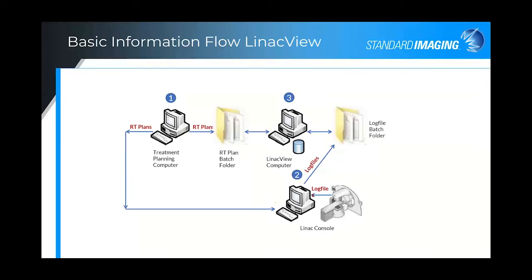So here's the basic information flow for LinacView. You start with the treatment planning computer and exporting the RTPlan. The RTPlan is exported to a batch folder that LinacView monitors, and it picks up and imports those RTPlans. And as well, the RTPlan, of course, is exported through the pathway to get to the Linac console.